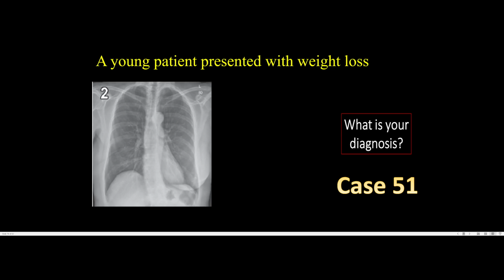She had the right breast removed, and now we did a chest X-ray, and we want to look for pulmonary nodules. You always want to zoom in for pulmonary nodules if there are any. Maybe this one. This is more than likely to be a pulmonary nodule. Again, you'll order a chest CT to further confirm your case, or even zoom in. But I have a suspicion this is a pulmonary nodule. You'll need a previous chest X-ray or order a chest CT to look for pulmonary nodules.